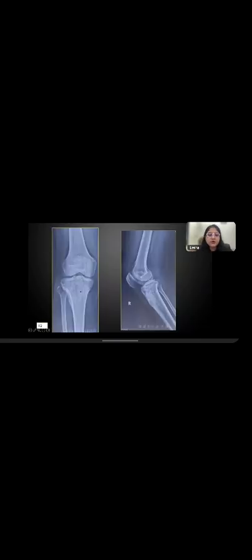Similar case of chronic osteomyelitis in the proximal end of the tibia. See, there is increased cortical density, differential kinds of densities in the proximal end, not much of a soft tissue component or periosteal reaction. So this is a case of chronic osteomyelitis. Why not Brodie's abscess?